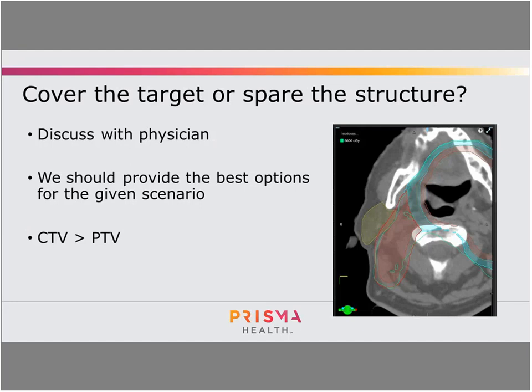One thing that comes up a lot is, do you spare a structure or cover a target? And this is definitely a physician call. If you don't have clear guidance from the physician, one thing that's really good to do is to make a plan doing both. So you give them 2 plans to choose from, which isn't always ideal, but it's a great way, especially for you, to know what the 2 extremes are.